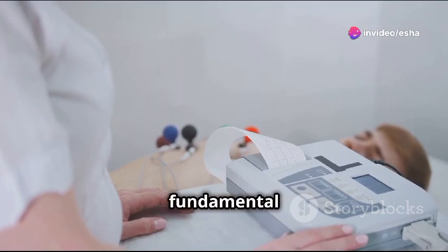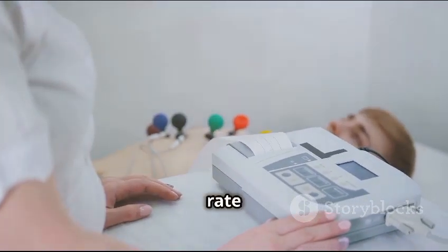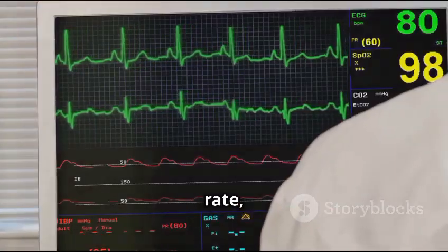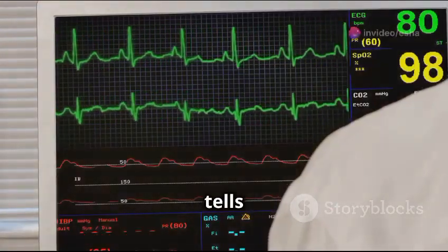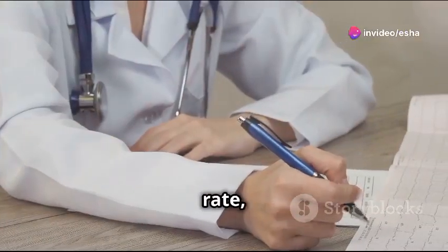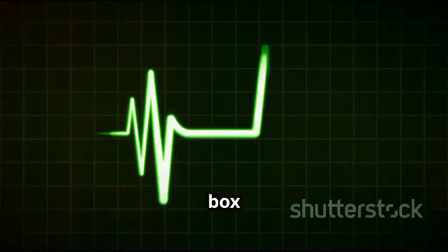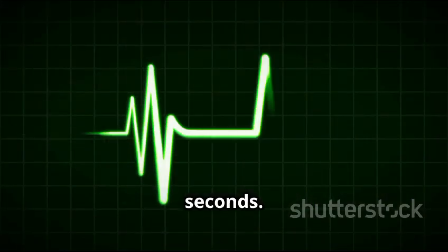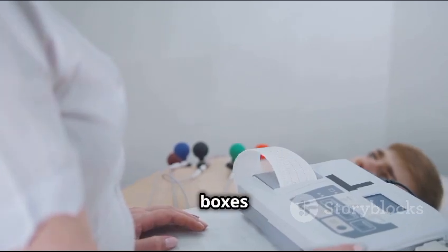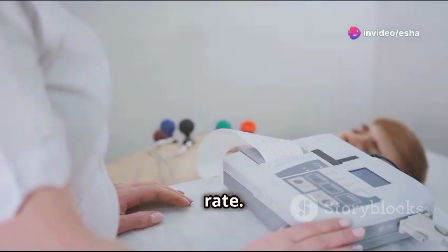One of the most fundamental pieces of information we can glean from an ECG is the heart rate and rhythm. The heart rate, measured in beats per minute, tells us how fast or slow the heart is beating. To determine the heart rate, we use the big boxes on the ECG paper. Each large box represents 0.2 seconds. Count the large boxes between R waves and apply a simple formula to calculate the heart rate.